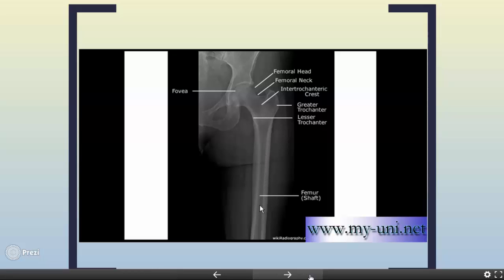cavity, and that cavity of course is filled with lipid-rich yellow bone marrow and clearly has a different density than the cortex. Keep in mind that the bone surrounds the cavity from all sides, of course, but this is the pattern that you should see if the bones are normal. Also notice the remodeling of bones, as if the artist who created them was very professional in creating the perfect shape that he wanted to create.